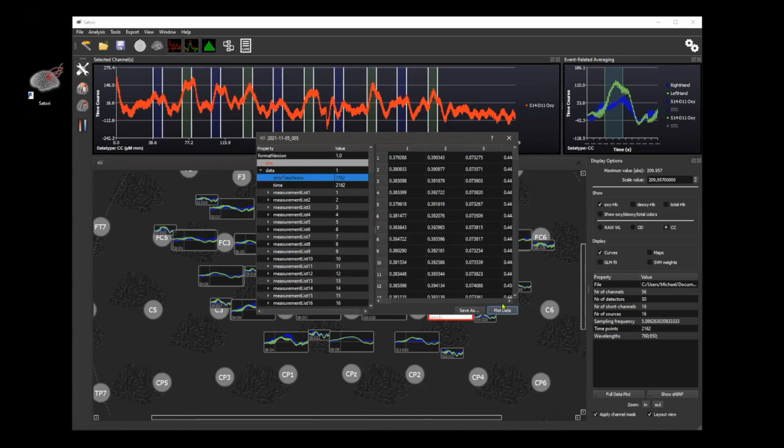You can just open it, you can plot the data, but you can also save the data as a CSV, for example. So if you want to extract information from an fNIRS file and just grab it into another format, for example CSV, just save it as a CSV and then load it, for example, in Excel.